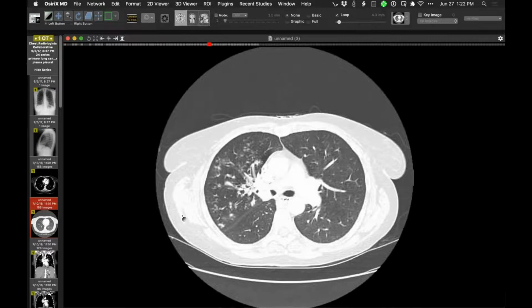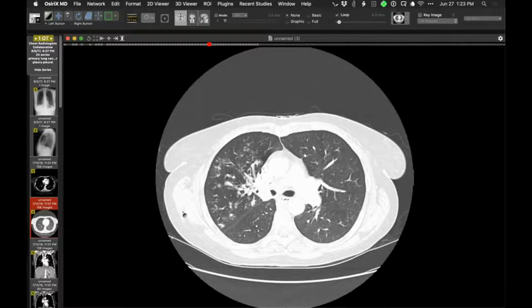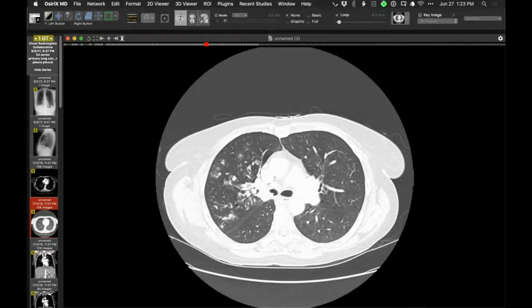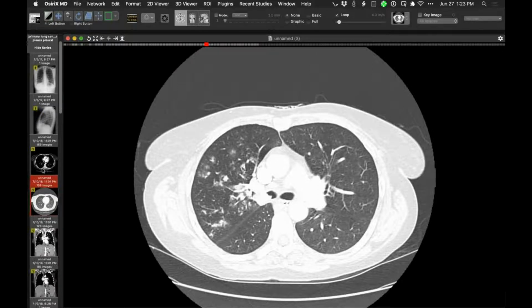If you look at this image, you'll see there's a substantial amount of abnormality in the right upper lobe. So we have a lot of material in the lumens of bronchi. We have airway-centric opacities. But of course, we also have that, and I don't know if that was really perceived as a thing in that right main bronchus. But she just kept on being treated for pneumonia.